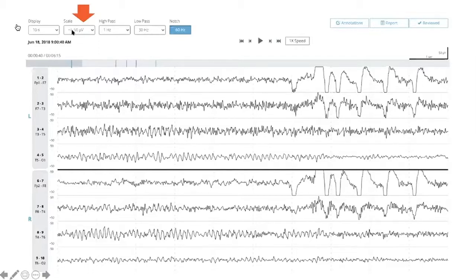Here, plus minus 50 microvolt means it goes from plus to minus 50 microvolt, means the space between the two horizontal lines is 100 microvolt. So what does it mean? Anything that is above 200 microvolt starts making me worried.